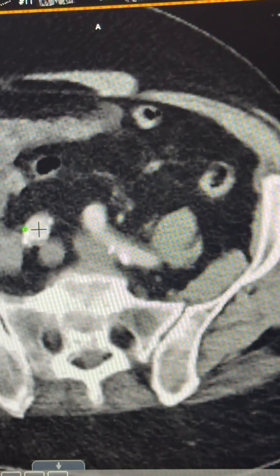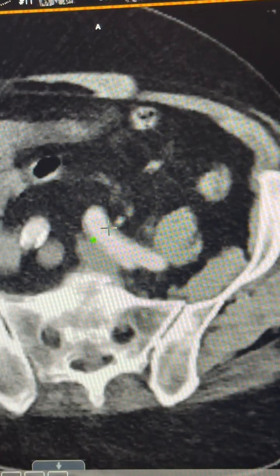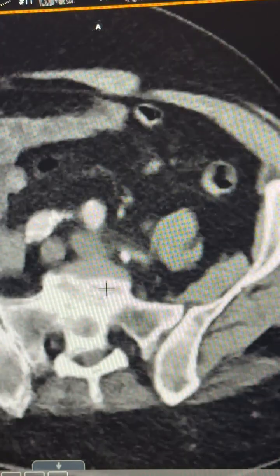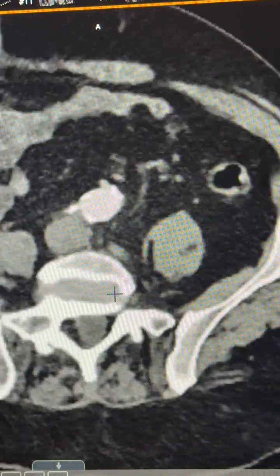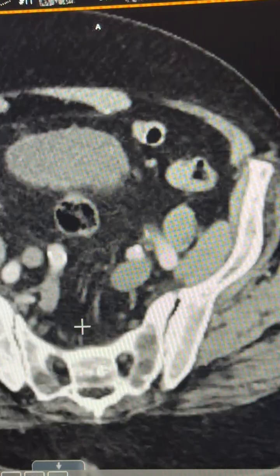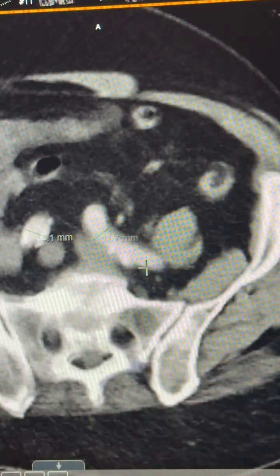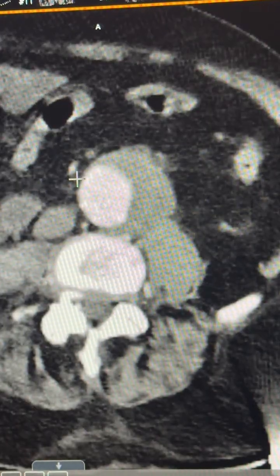And then here is a short right common iliac measuring 14, so I think a 16. And over here, again, it's a little hazy, so it's hard to tell. That's about a 12 or 13. So I think 16s would probably be better, looking at how they come up right next to each other. But I think I'd probably want to put the main body up on the right hand side and then let the left wire slide in from the back and enter. So I think that would be my plan.